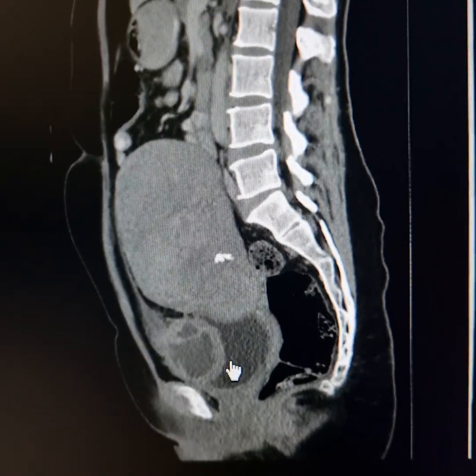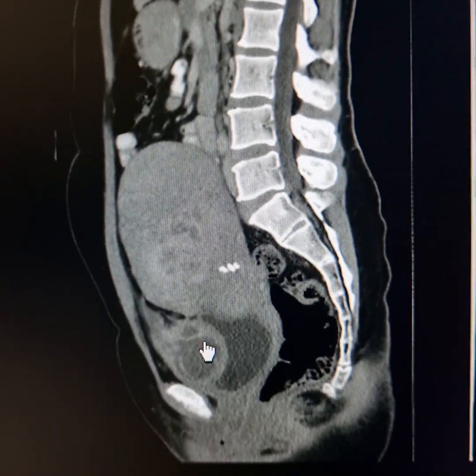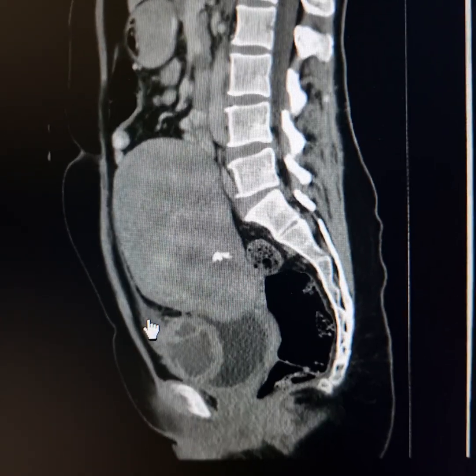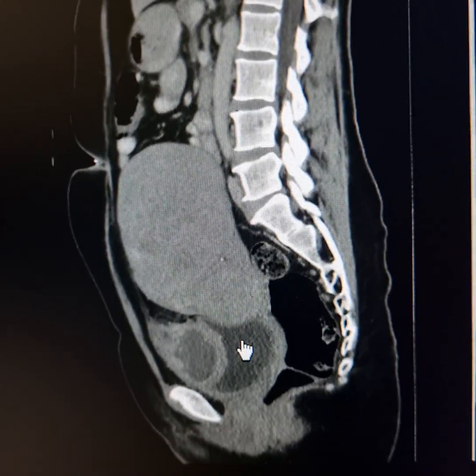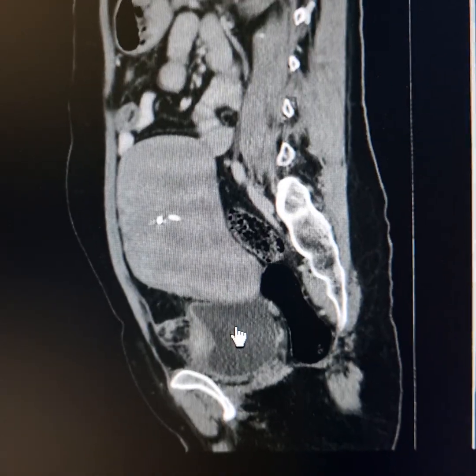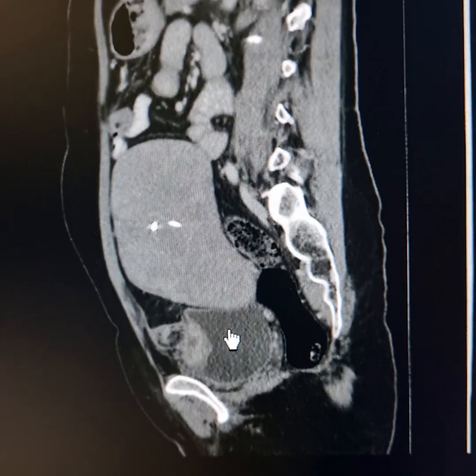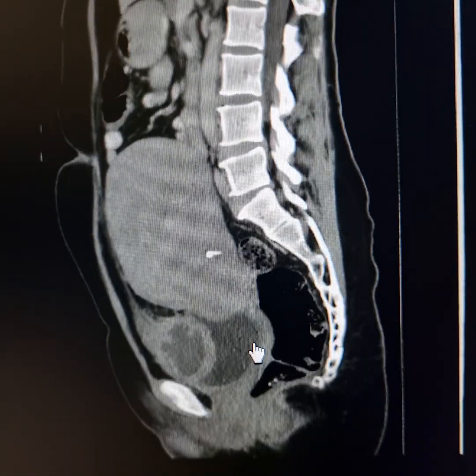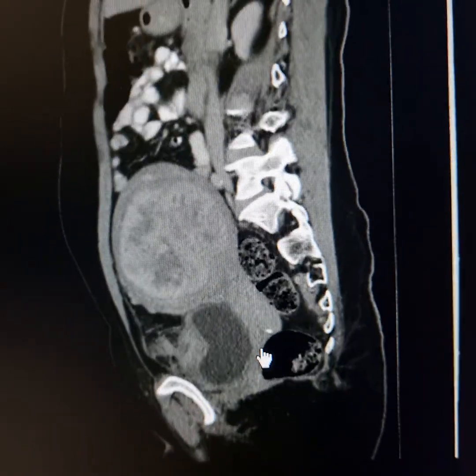It has indented the anterior wall of the urinary bladder, marked surrounding inflammation. Now this is the median umbilical ligament, which is also inflamed. It extends upwards. The space of Retzius is quite notorious for hematomas, abscesses, and for accumulation of urine in extraperitoneal ruptures of the urinary bladder.